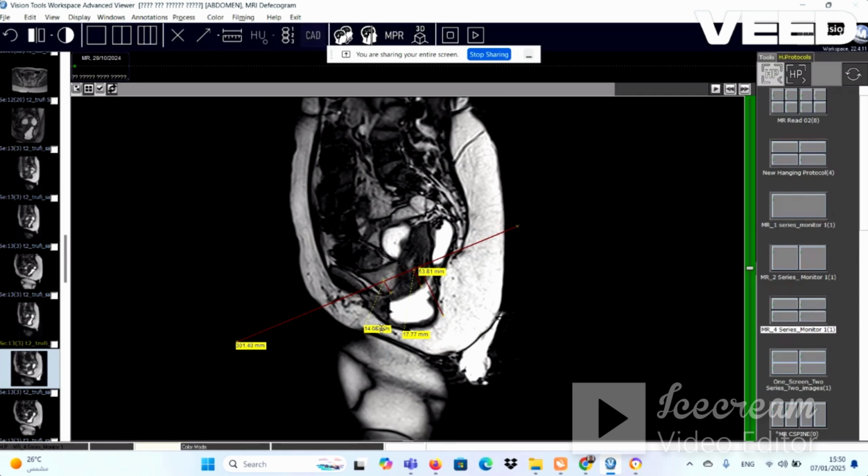Also, we have here the orientation of the urethra, most likely horizontal. So we have urethral hypermobility. And sometimes if the urethral orientation is kinked or transverse, this can make difficulty in urination.